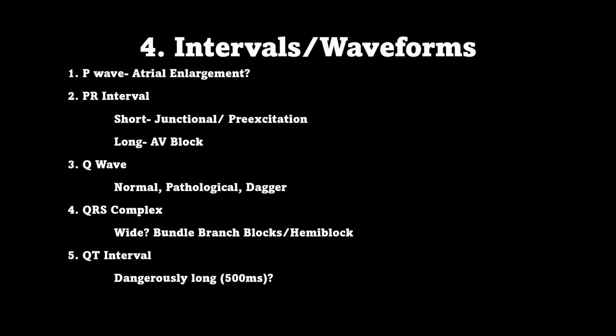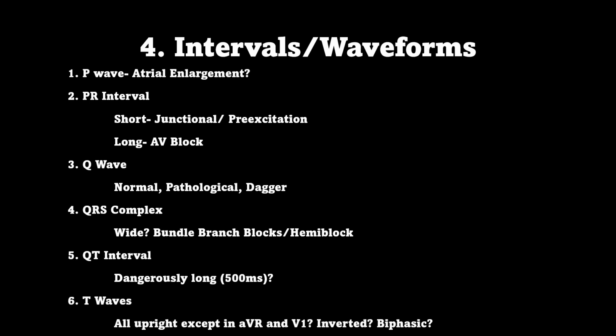And finally, look at the T waves. They should be upright in every lead except for AVR and V1. And then look at the morphologies. Are they symmetrical? Are they asymmetrical? Are they inverted? Are they biphasic? When they're biphasic, are they up-down or are they down-up?